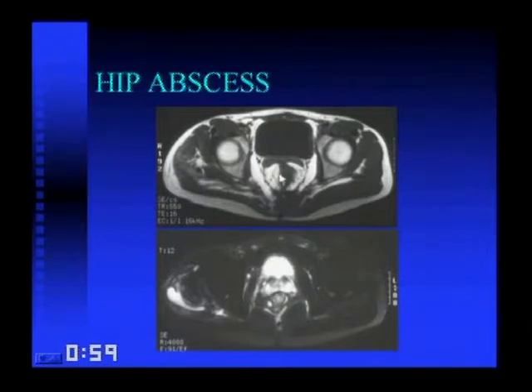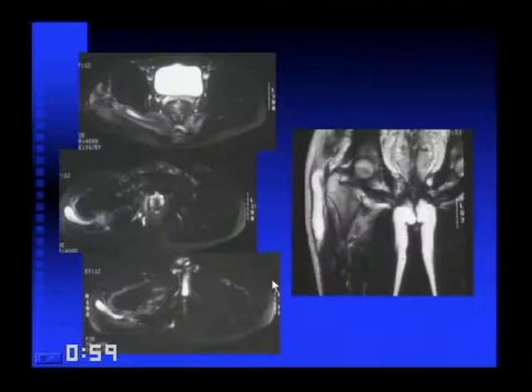Here you see the perirectal inflammation. And notice here the fistulous tract here coming here. And look at all of this out here in the right gluteal musculature. Here's another normal prostate, by the way. And here you can see just more extensive involvement. Here you can see it going into the iliacus muscle. Here it's going out laterally into the gluteus musculature as well.